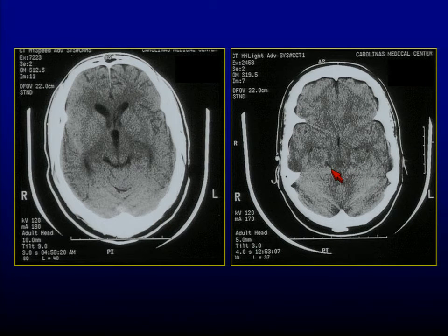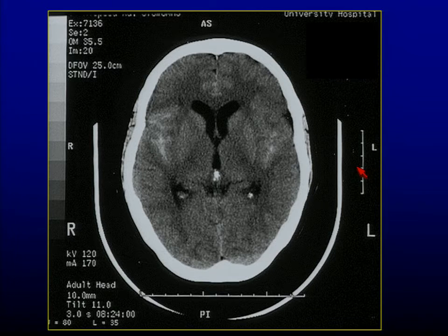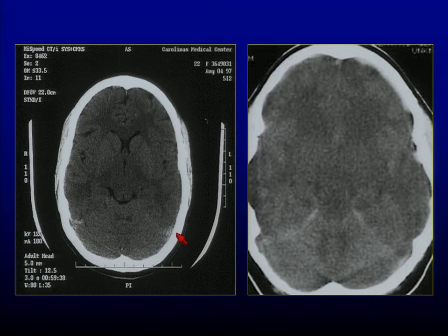I saw it on the prior slide. I lost that circummesencephalic cistern. This is someone who's not only lost the circummesencephalic, but now they've lost their quadrigeminal cistern. Again, checking the sylvian cisterns, looking for subarachnoid hemorrhage. This is your last chance to find it in the mnemonic. If you didn't see it when you went through the look for blood, just checking the 4 cisterns we care about. Just look and be sure there's no blood. And again, look for pressure.